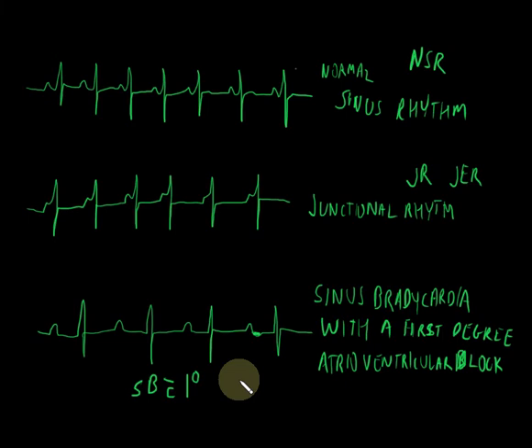Sinus tach with a first degree block, if it's under 150, we don't even need to worry about it from an emergency standpoint. What will happen is the docs would refer this person to a cardiologist, and I like to lump patients into one of several categories. You've got category 1, which is there's either nothing wrong with you, you have a perfectly normal rhythm. That's going to be this one right here.